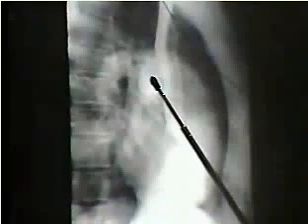The outflow tract of the main pulmonary artery is quite continuous with the left pulmonary artery. Hooks right on back without any clear demarcation. The right pulmonary artery, on the other hand, comes off almost at right angles to the left pulmonary artery to cross the mediastinum in front of the airway. And here we see the bronchus being crossed by the right pulmonary artery in front of it. The left pulmonary artery then continues posteriorly to go over the left bronchus before heading inferiorly to become the descending limb. Meanwhile, of course, this left pulmonary artery has given off some branches to the upper lobes, which we will not have to study any further here.